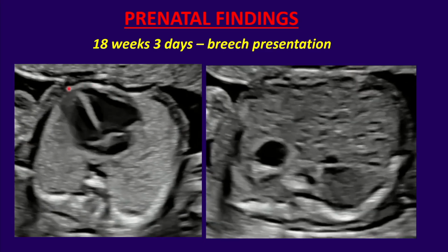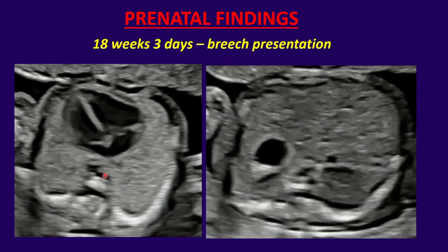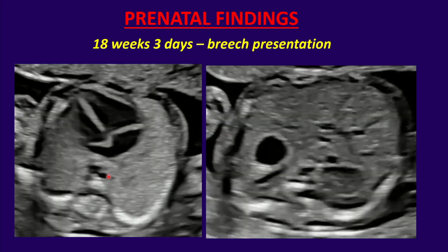Okay, pretty symmetric chambers in the heart. Aorta, and a dilated vessel next to it. Is it the azygous vein? Very likely. This is a typical location. So it's not that dilated like in the previous case.